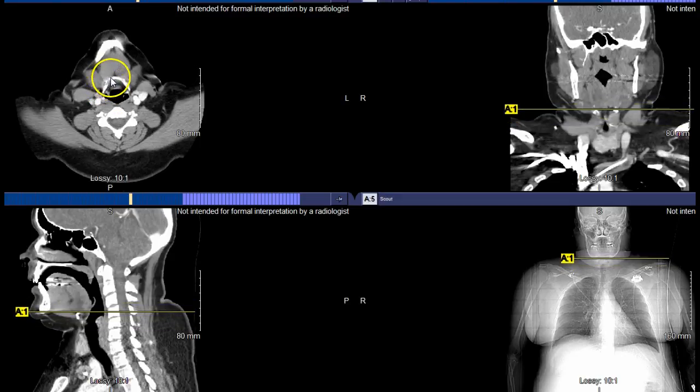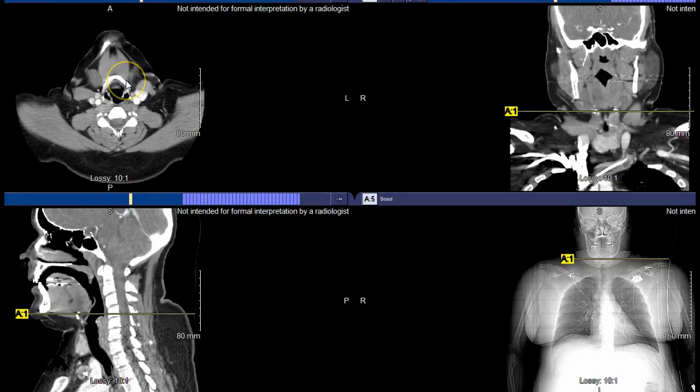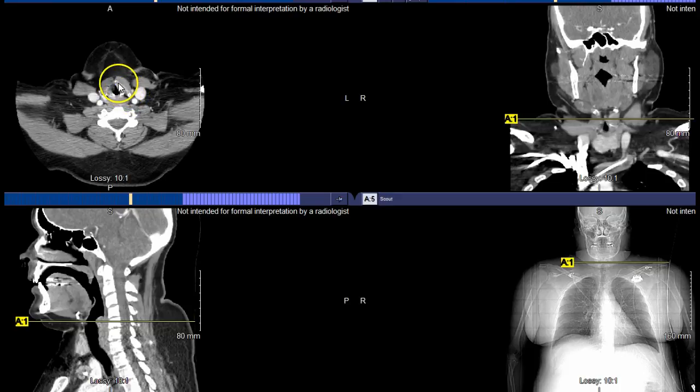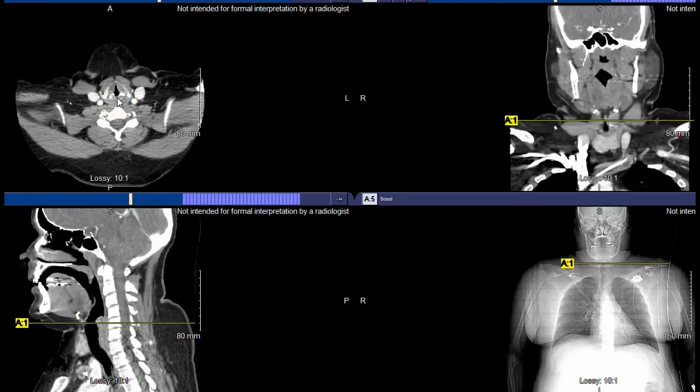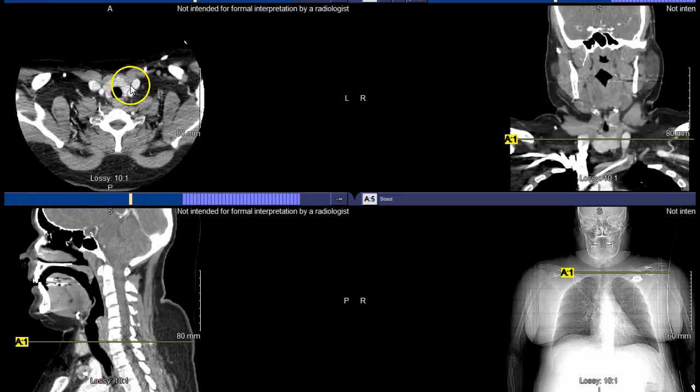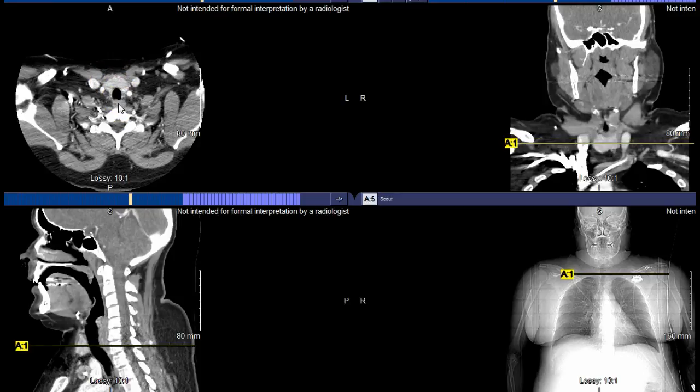So you can see where that hyoid bone is. And we know that as that transitions down, you'll be able to see the cartilage of the larynx, so that thyroid cartilage versus that cricoid cartilage there, respectively. We can see subsequently where the thyroid gland is, and where the trachea is, and where the esophagus is. So a lot of really cool structures.